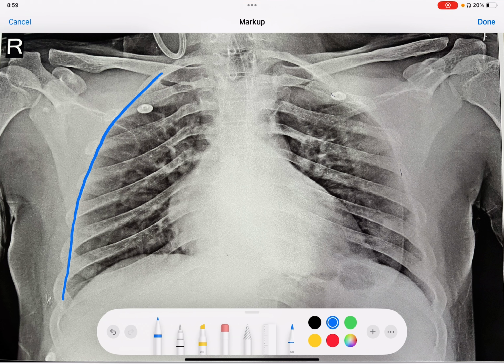So how can we make it out? We can make it very simply. When we want to say that we are seeing the lungs, we need to see the bronchovascular markings. So bronchovascular markings will appear reticular, means lines like white lines, which usually contain bronchial artery, bronchial vein, pulmonary arteries, pulmonary veins.